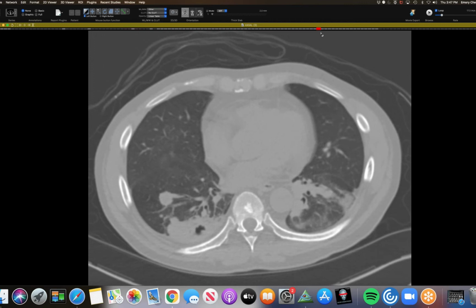And one more thing about distribution, crypto likes the lower lobes. I've seen a number of cases where you've had a couple of nodules, say in the superior segment or farther down in the lower lobe. Aspergillus seems to like mid lungs. Mucor likes mid lungs and can move toward the apices. It's sometimes at the periphery. Aspergillus tends not to be at the periphery, but that's a fairly common pattern with mucor, to be right out against the edge of the lung.